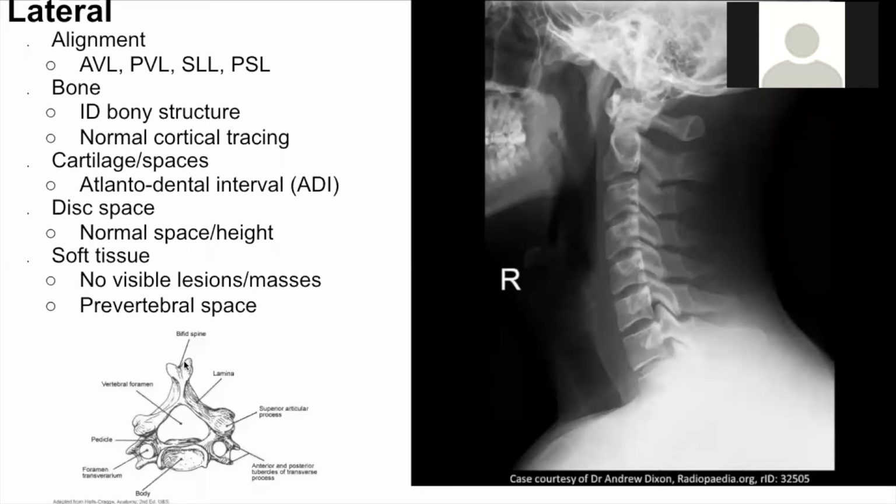So if you see here, lamina, spinous process, when these connect, it becomes really thick here. And that thick portion is this really evident line here. So that's the spinal laminar line. We draw the line straight down through here. That's the spinal laminar line. So lamina, spinal laminar line, spinous process.